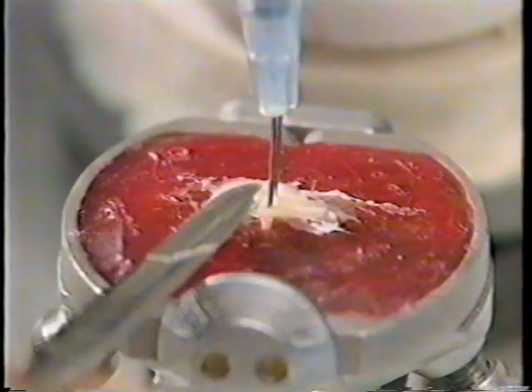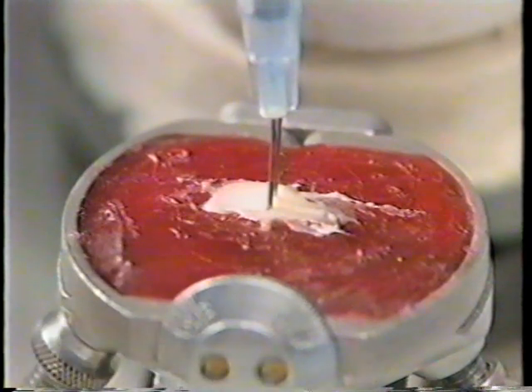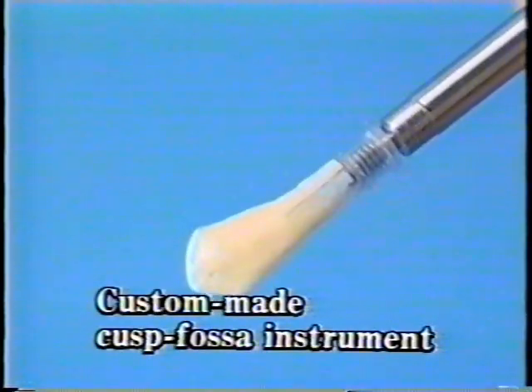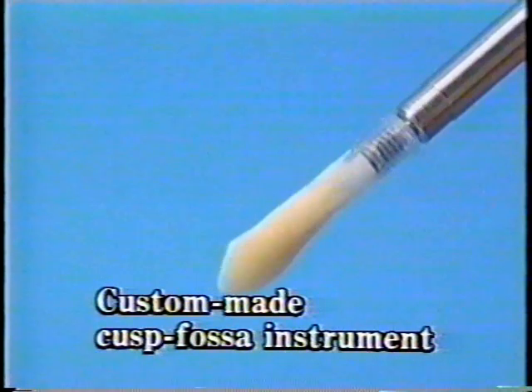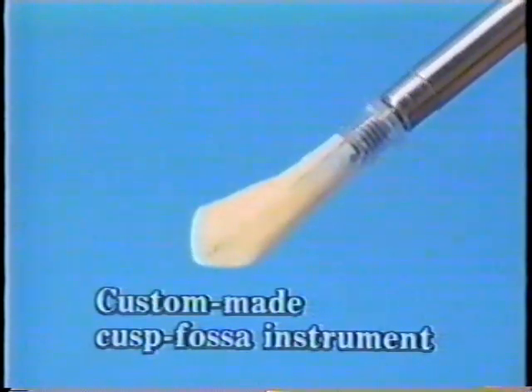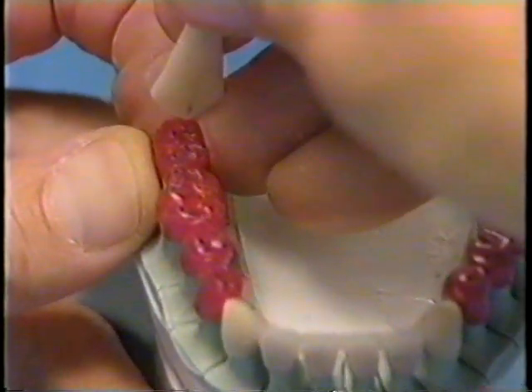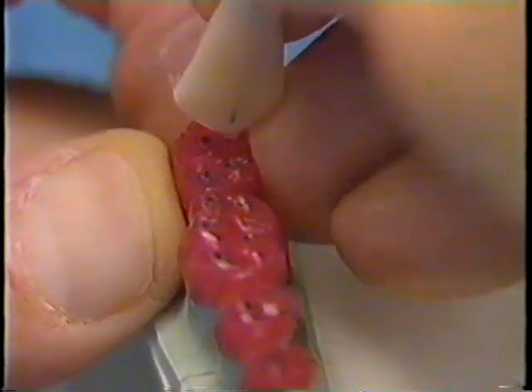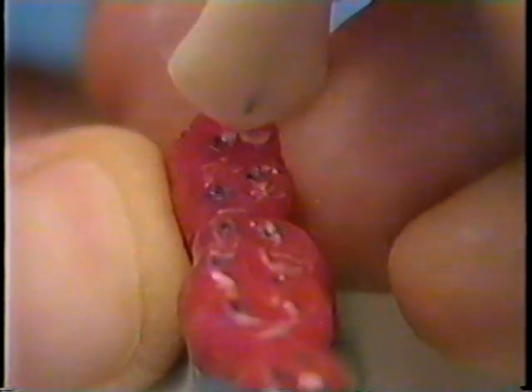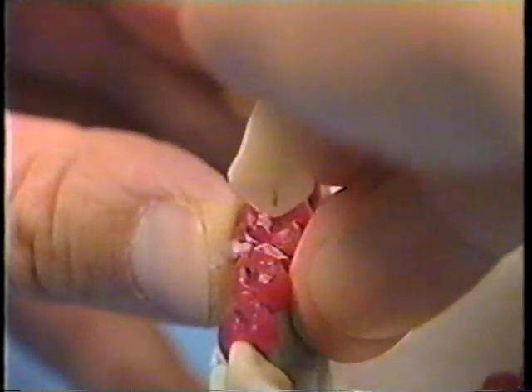We produce the cusp fossa instrument by pouring resin into the wax impression. We'll place the tip of the instrument on the central occlusal point and sculpt the disengagement angle by scooping out wax while using the spoon-shaped portion.